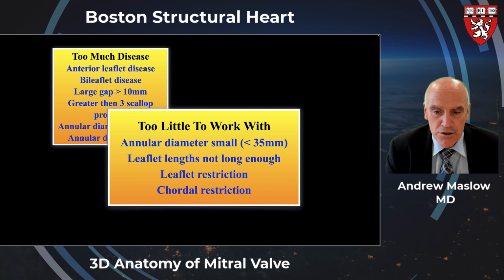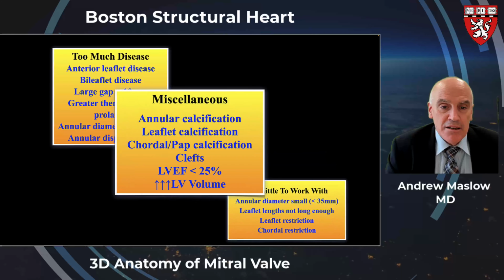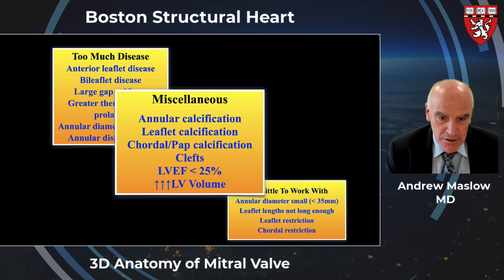Ideally, you'll start with a larger mitral valve area because any repair, surgical or percutaneous, will always reduce the mitral valve area compared to a normal native functioning valve. If the leaflets aren't long enough, then in order to repair those, they either have to be elongated or brought closer together, and that would be by reducing the annulus significantly, again predisposing towards post-repair stenosis.